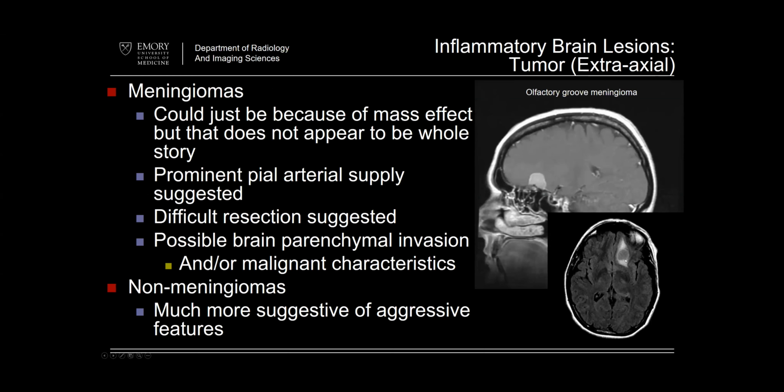If you have what looks like a meningioma here and you have edema next to it, this is probably prominent pial arterial collateralization. Every now and then it means the brain is being invaded by the tumor, but this looks pretty sharp on the margin, so probably not. So it's probably that. Whenever I ask residents or fellows about this, usually people will say the edema is related to how big it is, but I've seen tiny ones have huge edema and huge ones have tiny edema or no edema. And I learned from the neurosurgeons that there's an increased risk of bleeding and stroke when you have more edema there. And if you'll pardon the pun, it's hard to peel off the brain. So pial arterial collateralization, that kind of stuff.